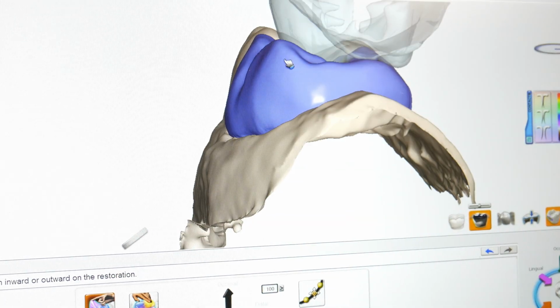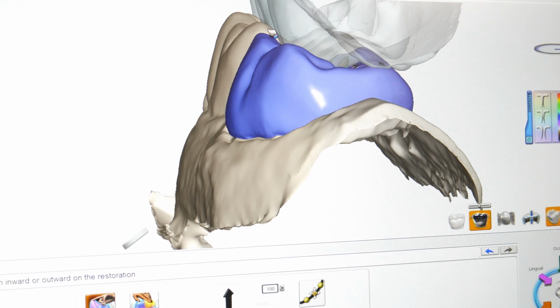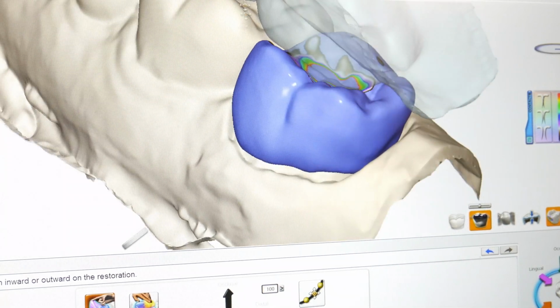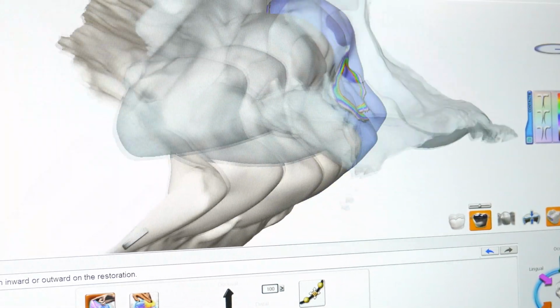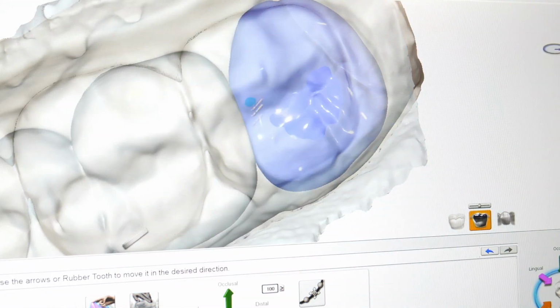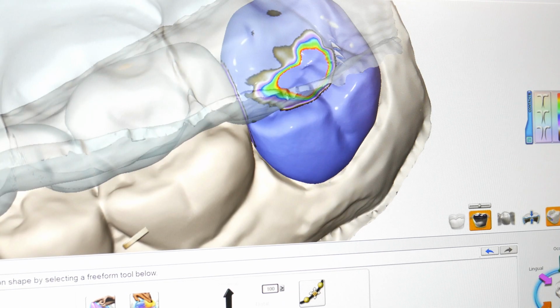I'm also checking these buccal cusps to make sure they're not too flared out, which leaves a shelf for the cheek to sit on, and then they just constantly bite it. So that's definitely one major thing I love checking, making sure your teeth are hugging each other, those buccal cusps. All right, so at this point, I'm going to cut my losses and just let the doctor know that we will need to adjust opposing on this case.